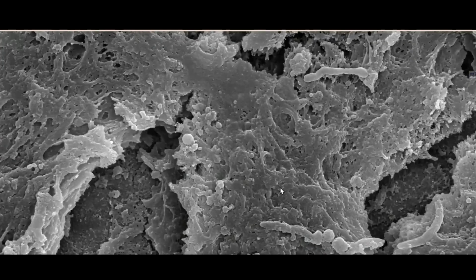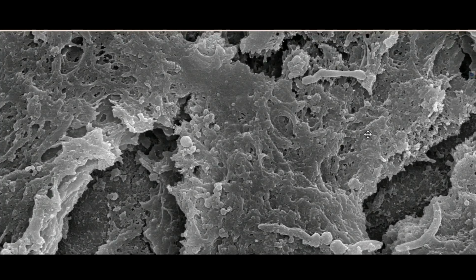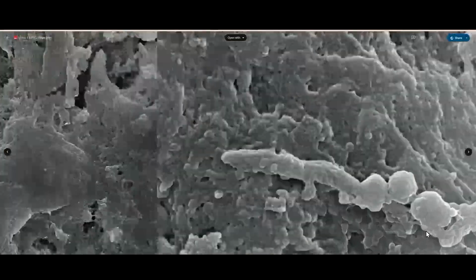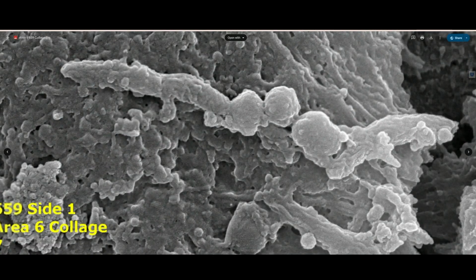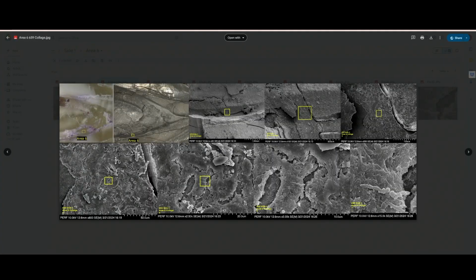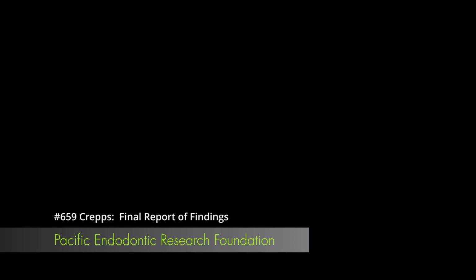It's very, very hard to say, but I would spend some time, go through the stitched and the collage images, and refine your pattern recognition, because this is a very good example where you have decalcification, demineralization going on, and also extensive biofilm right in the demineralized tissue.